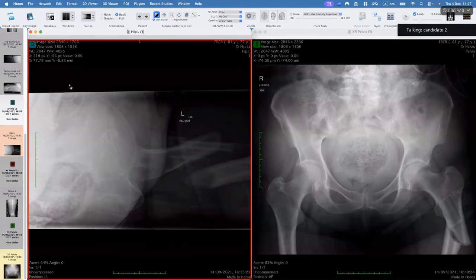Sir, there is a generalized mild decrease in bone density, because I can see the trabeculae prominently. I am thinking of it in terms of a fracture because of the decrease in bone density. I think the bone density is pretty decent for a 77-year-old female. Okay.